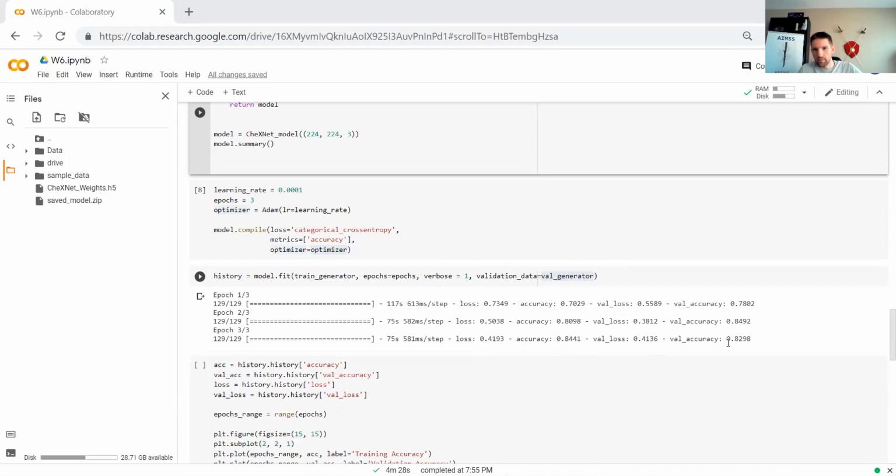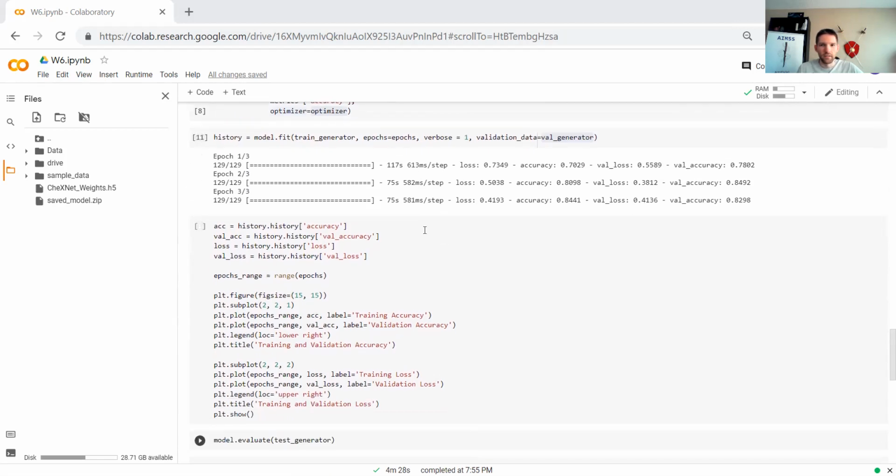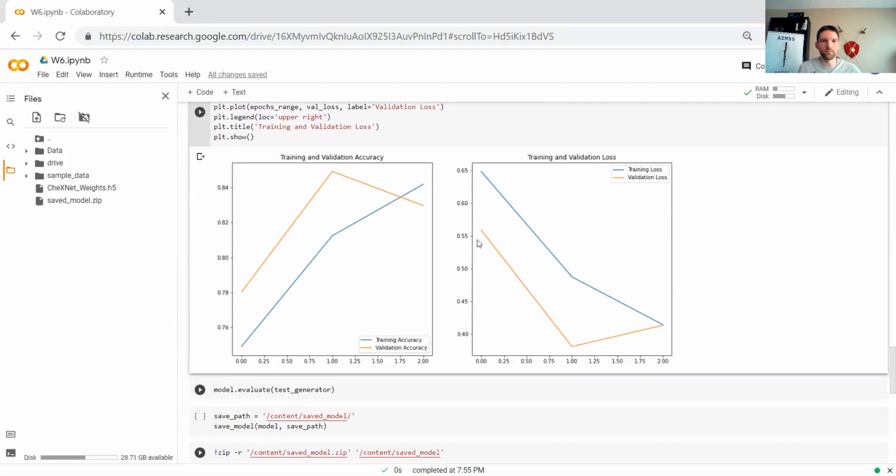Loss went up this time, accuracy went down, but that's common in the first couple of epochs. You'll find that with about 40 or so, it'll decrease quite nicely. And then this is some code just to graph it. I'm not going to go through that in detail, especially since we're a little low on time. But that'll graph training accuracy, validation accuracy. Not very pretty with only 3.